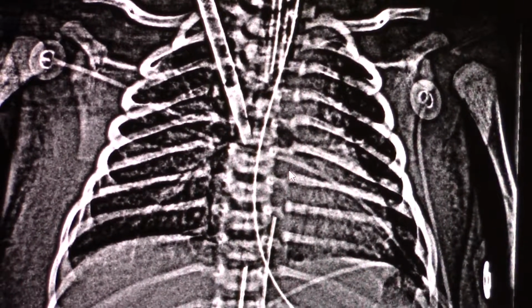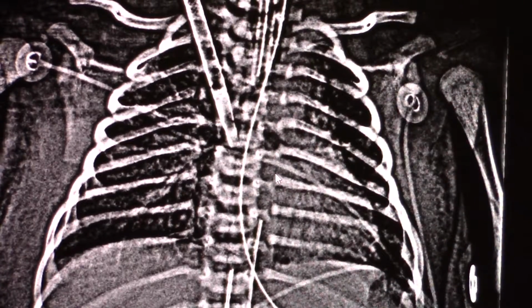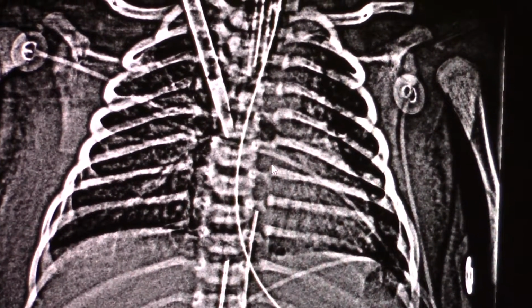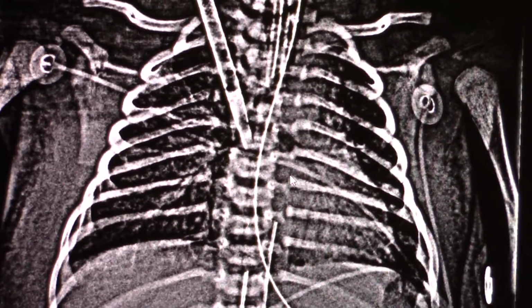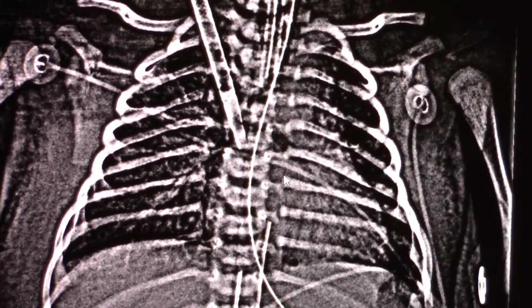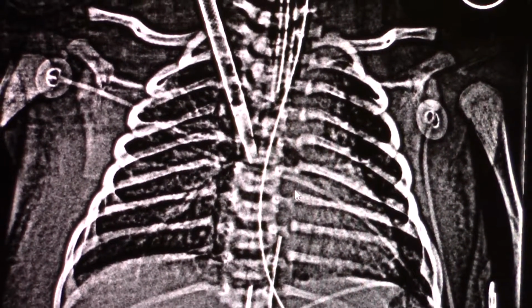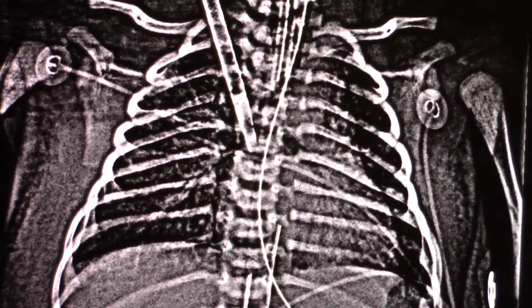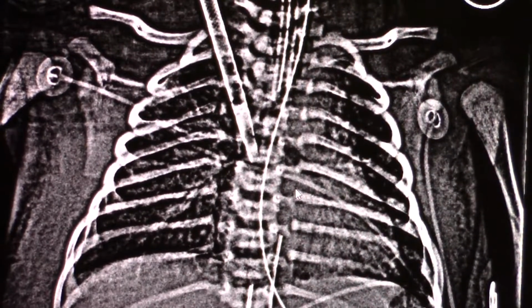if they don't shoot the x-ray at an exact 90-degree angle, because the ribs are more of a plane since they wrap around, when you change the angle of the x-ray to the position of the patient, it'll make the ribs look like they're rotated higher or lower in the chest. If you're just looking at the rib placement, using the rib as a reference might lead you to believe that the tube is at the second rib when it really is at the third or the fourth or the fifth or whatever.